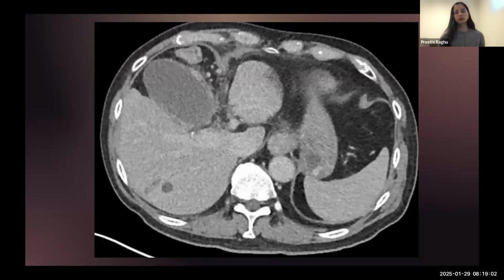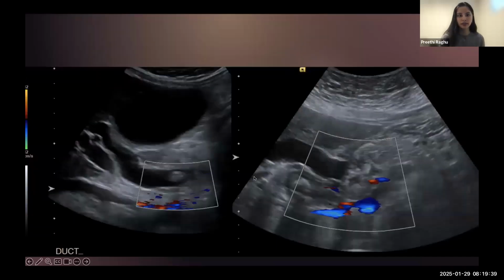So this person was taken to surgery, and based on the CT, we didn't see any radiopaque stones on CT, but as my prior case showed, sometimes that's just a limitation of CT itself and may not be true. But in this case, it was actually a patient with acalculous cholecystitis, and so whether or not it's calculus or acalculous, we sort of see the same other features by imaging of distended gallbladder, gallbladder wall thickening, and a little bit of pericholecystic stranding.